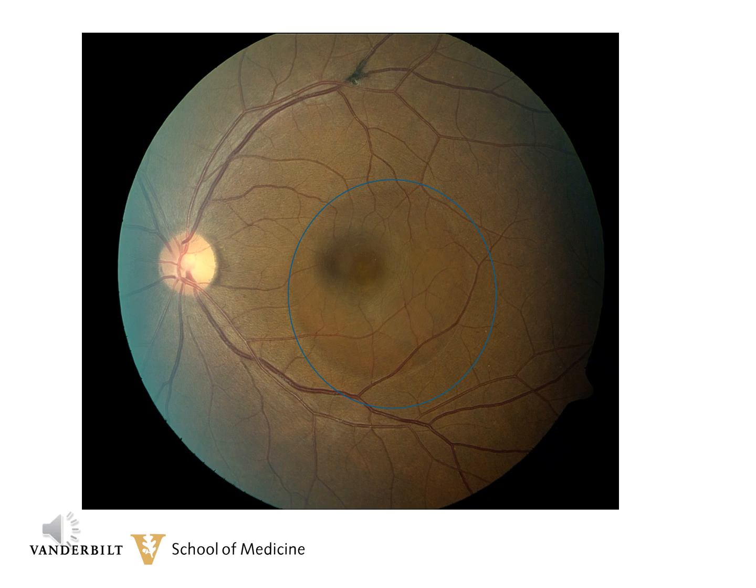And if you look three-dimensionally with this, you would see that the retinal vessels are elevated, but not the pigment epithelium. And if you can get your slit beam to the side, you'll notice that the vessels will cast a shadow on the pigment epithelium. And this is a case of central serous choroidopathy.